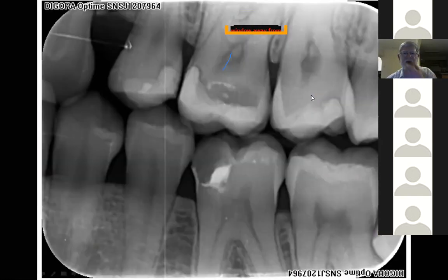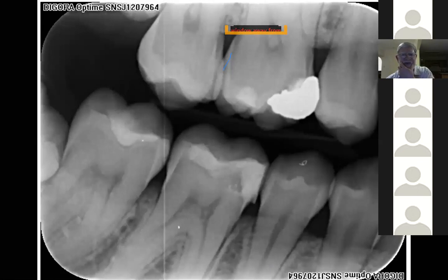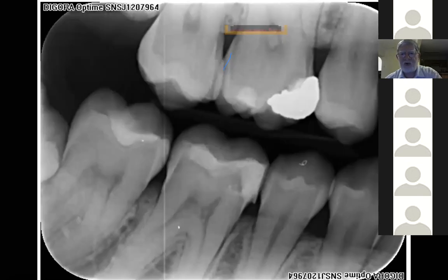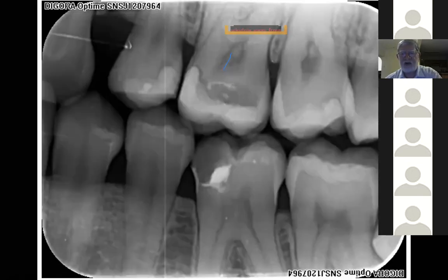Those x-rays, when I saw this and when I saw that, and you'll see this case in my book on caries, over about 10 or 11 pages. I wasn't convinced that this was caries. I sent it on to 3 colleagues of mine.